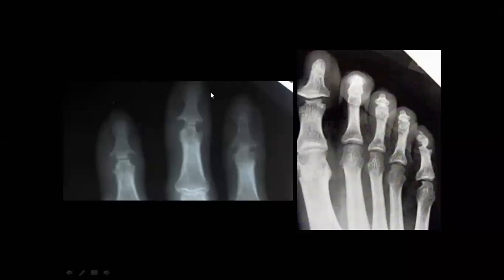Scleroderma, if you remember, Amna, we mentioned it is distal acro-osteolysis with some soft tissue changes. It is not hemoarthrosis, not deposition; you cannot see this as deposition arthropathy. Nermine, not rheumatoid, sure, because this type of erosion is not typical for rheumatoid. But okay, let's have a look.